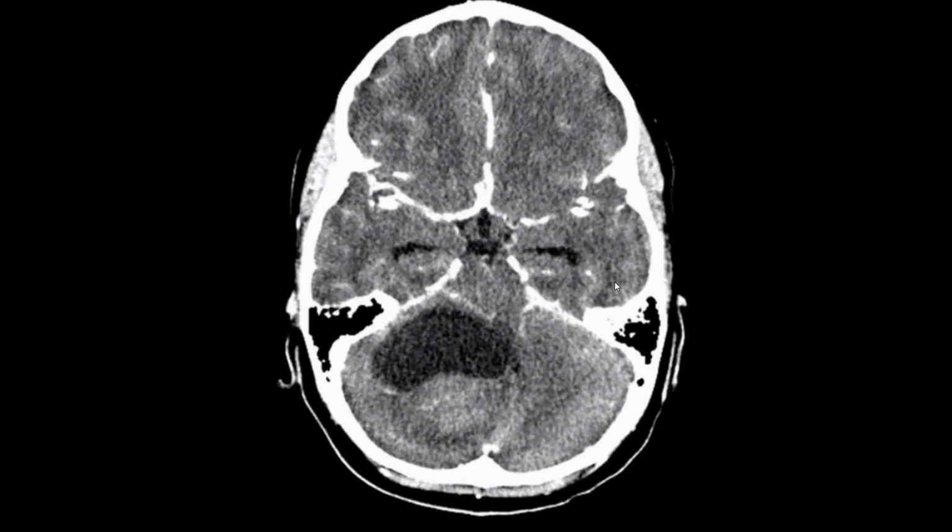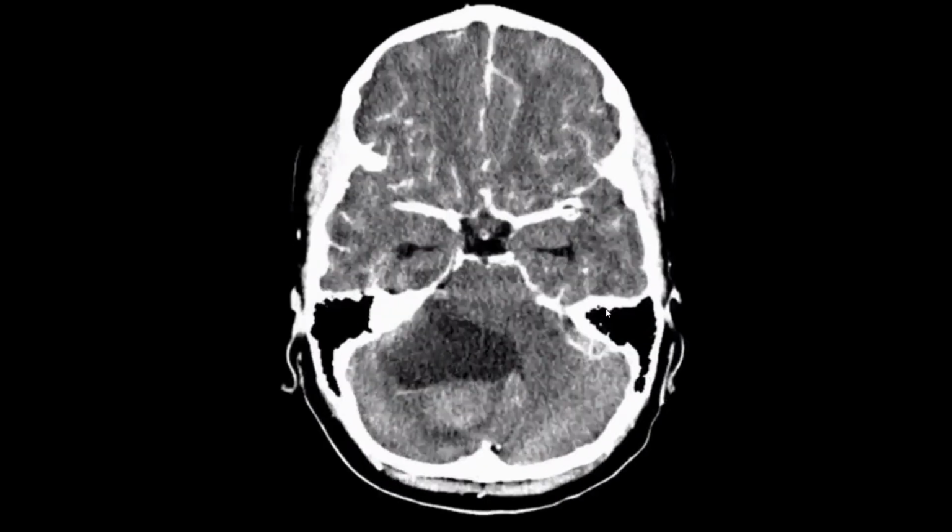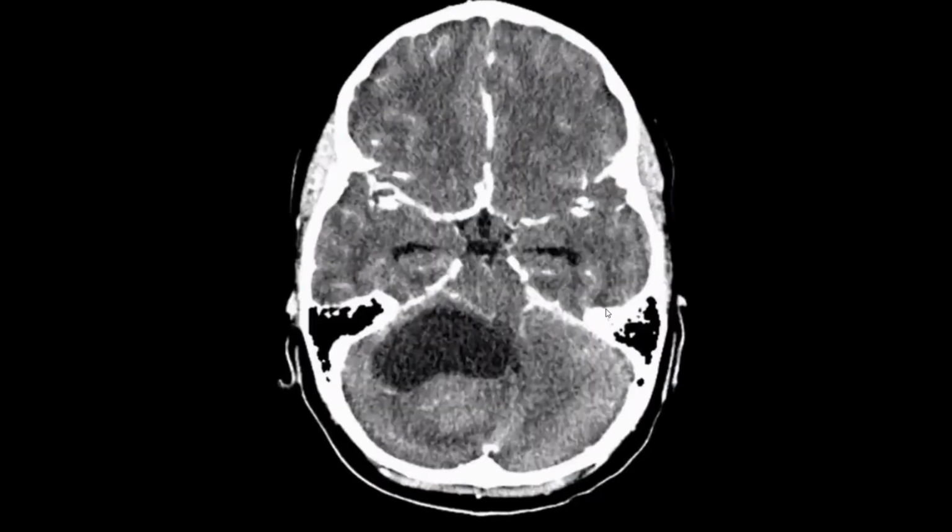There is a strong association between pilocytic astrocytoma and neurofibromatosis type 1. So you should search for any other lesions and manifestations. At least in the CT brain, you should check the greater wings of the sphenoid bone for hypoplasia or dysplasia. You should tell the examiner that you are searching for any association. That's good. Thank you so much.